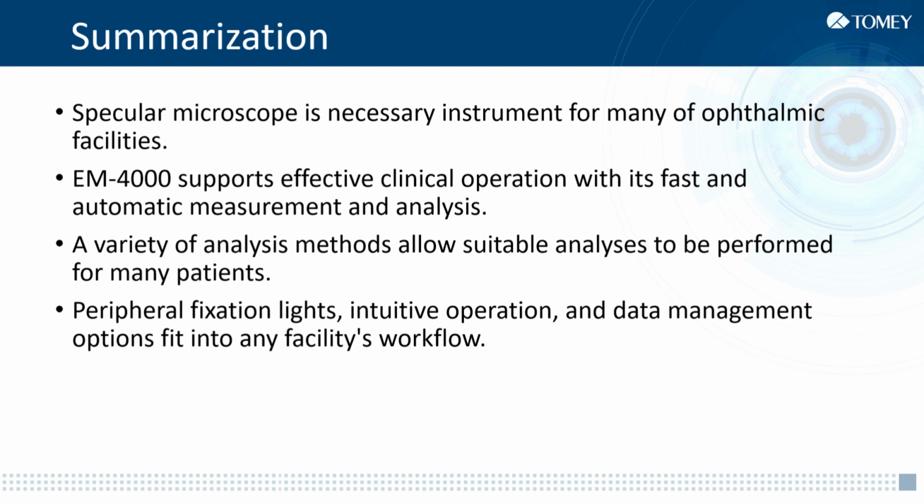Here is the summary. The specular microscope is a necessary instrument for many ophthalmic facilities. The EM4000 supports effective clinical operation with its fast and automatic measurement and analysis. A variety of analysis methods allow suitable analyses to be performed for many patients. Peripheral fixation lights, intuitive operation, and data management options fit into any facility's workflow.